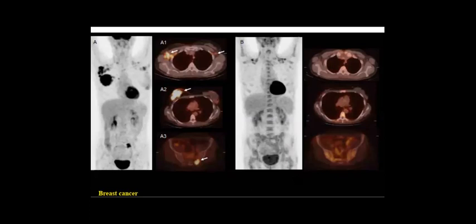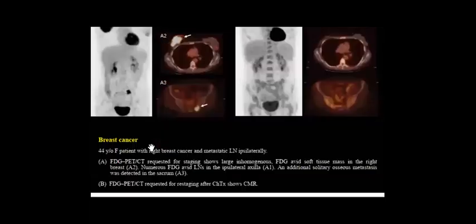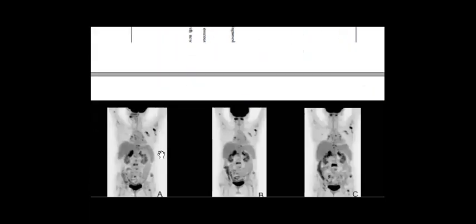Everything shows regression. Nirmeen, Asma. Yeah. So it's a nice case that PET-CT, they use it even for follow-up, yeah, to know the result of treatment. Is it good, or should they change the management of this patient?